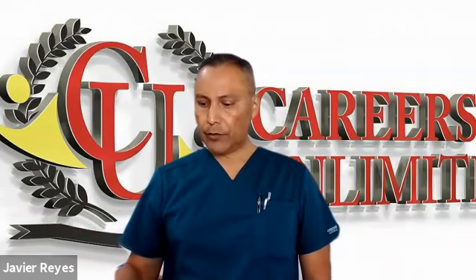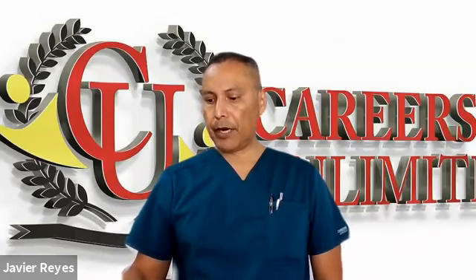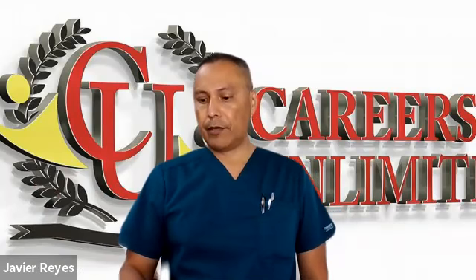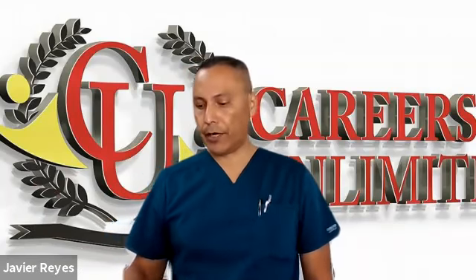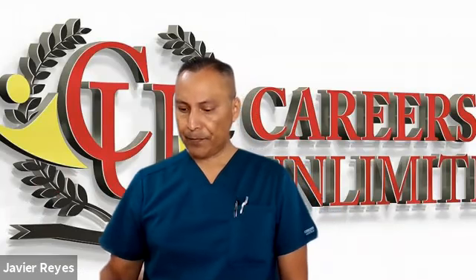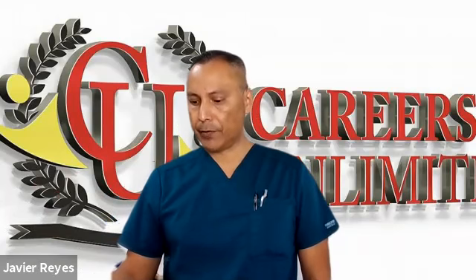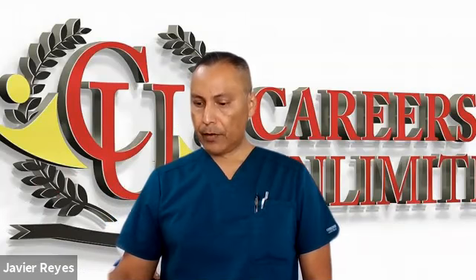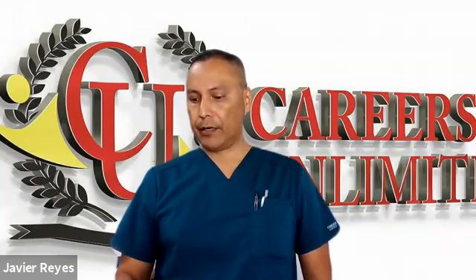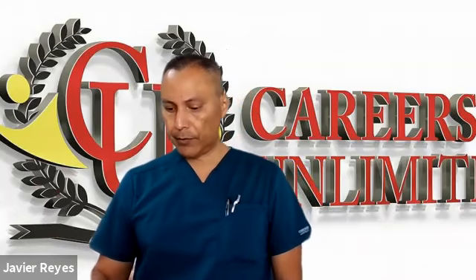So let's go through the criteria for classification. The rhythm, again, may be regular, so use your calipers, right? You're going to notice that they're pretty regular. All the impulses are occurring at the expected time. Sinus rhythm is usually the underlying rhythm, with both regular and irregular. The rate should be within normal. In this case, we have a rate of 3, 4, 5, 6, so you have 60, which is within normal.